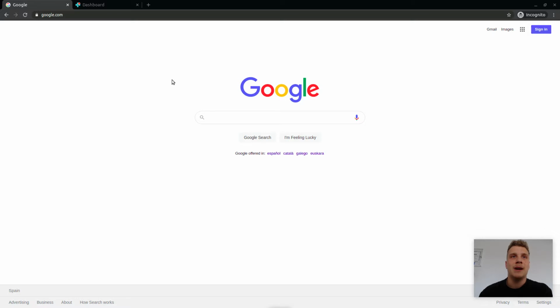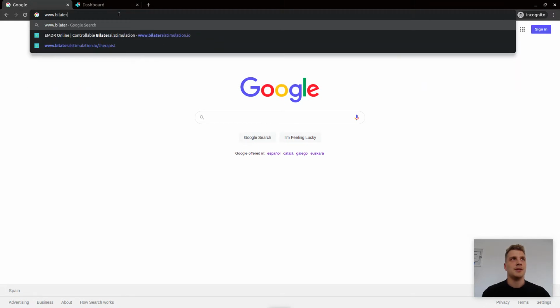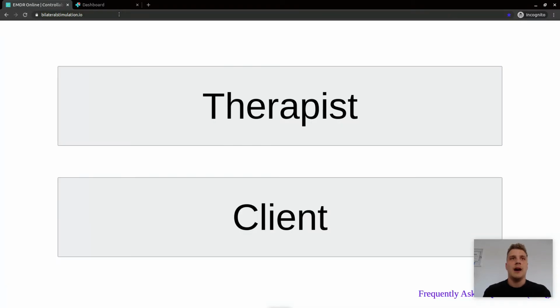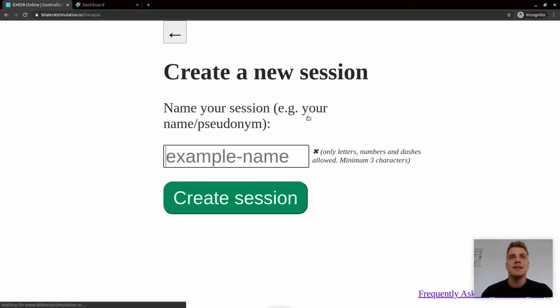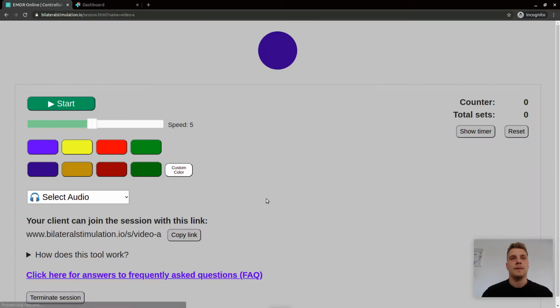Let's start by going to your browser and typing www.bilateralstimulation.io into your address bar. Now, you'll arrive at the home page where you can select therapist, and then you'll be able to create a new session. You can give this session any name. So you could type your name, or you could also type something more generic and then create the session.